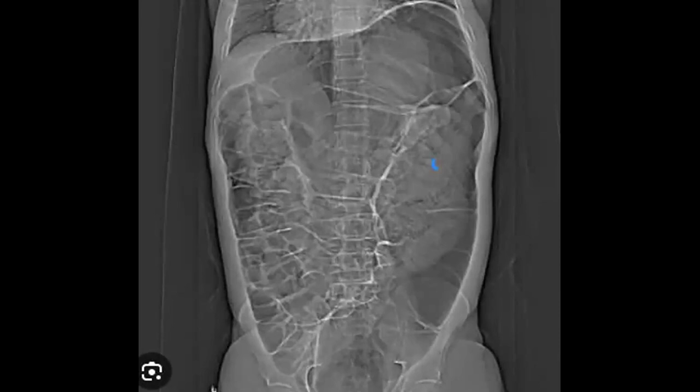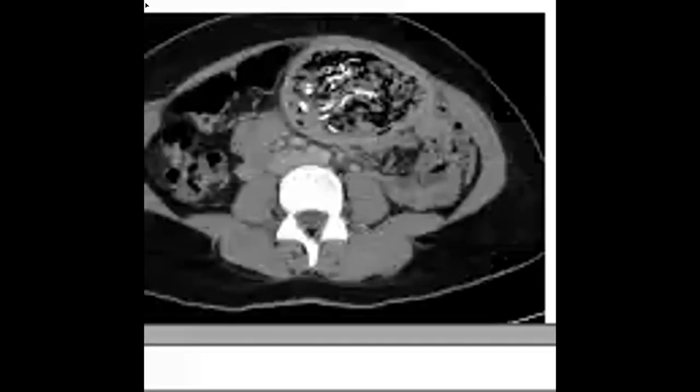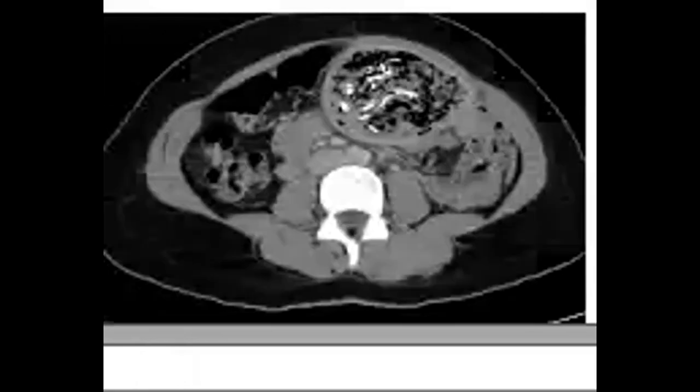Usually, patients who have marked dilatation of the bowel loops, no transition point, no leading point, as you see here. Sometimes you can see such an appearance even in practice. It's not a good sign to see it.